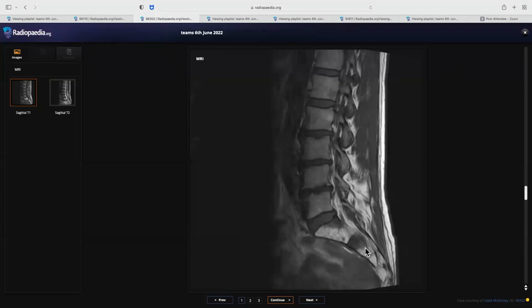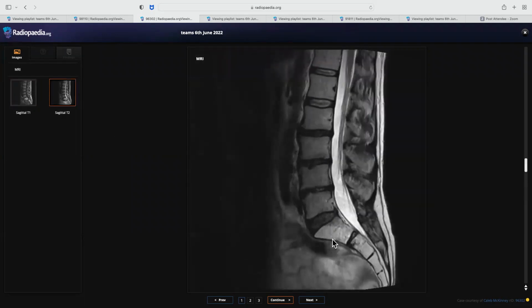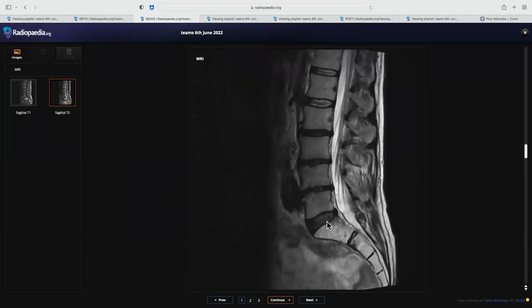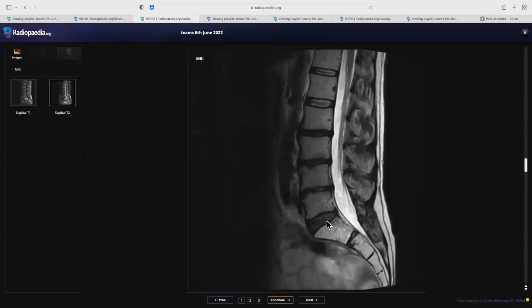Here you see on T1 weighted images some hypo-intense lesions. So basically this is the marrow edema which you were seeing on the coronal images, but it would have been better if you could appreciate those on the sagittal images also, because those lesions which were hypo-intense on T1 are bright here, signifying them as marrow edema. But in our routine practice, we see the coronal images. On sagittal, we don't think of those sacral insufficiency fractures. As soon as coronal comes and we see the marrow edema, we know it's sacral insufficiency fractures. So it was seen on sagittal also. If we pick up on that, it's all the more better.